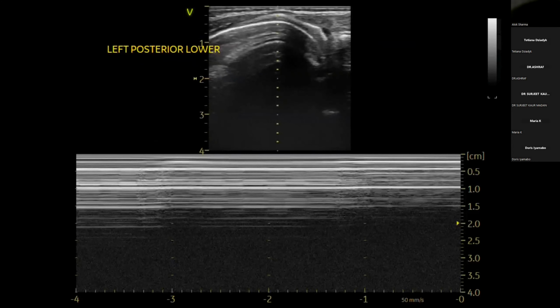Dr. Alok, this one. Yeah, absolutely no doubt about it. You have sliding there. Yeah, but this is barcode now, right? Barcode. And the question that I would ask is, first of all, there are two possibilities over here. So you're kind of in a situation where you're using a very advanced machine. And when you use a very advanced machine, if the harmonics are on, what the harmonics do is they actually reduce the artifact.